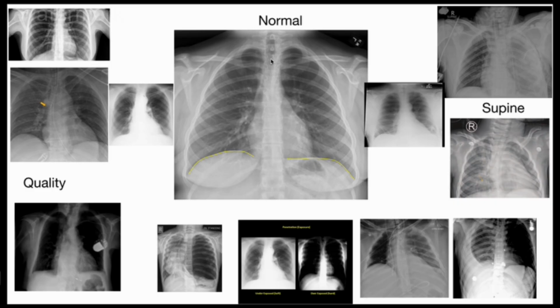And of course, we talk about the equidistance between the ends of the clavicles to that arbitrary line drawn through the spinous process. That means the patient is not rotated. That is very important as far as studying the mediastinal structures are concerned, and also the cardiac shadow.